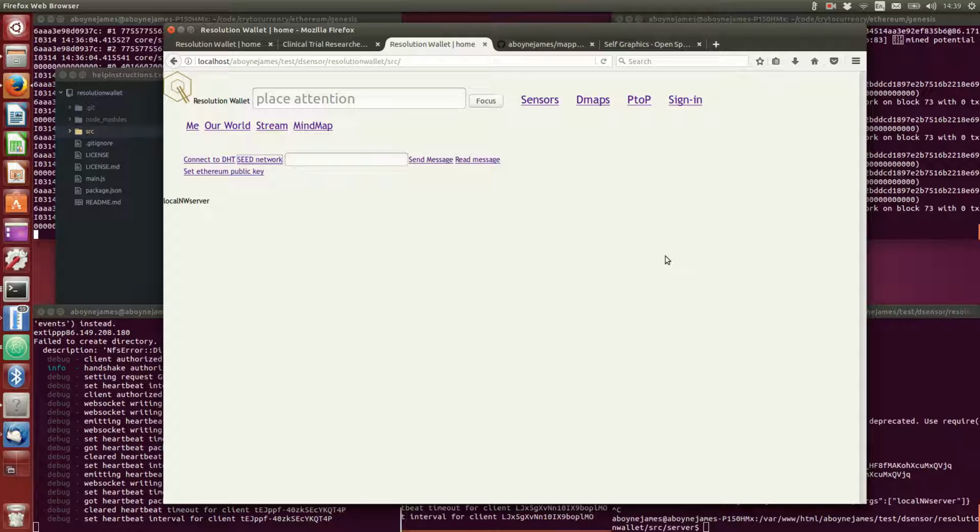Welcome to this D-Sensor peer-to-peer living cohort clinical trial demo using wearable data. The use case we're going to show in this demonstration starts with the individual here in white, and there'll be a trial manager or clinician running the trial in this blue background.